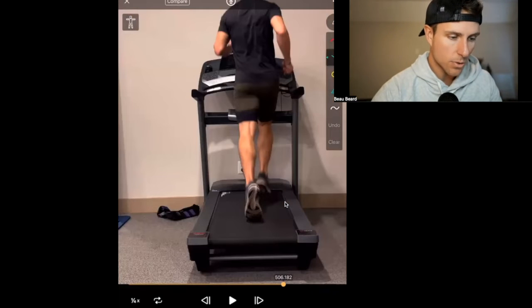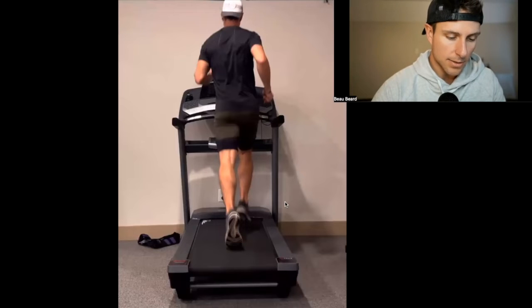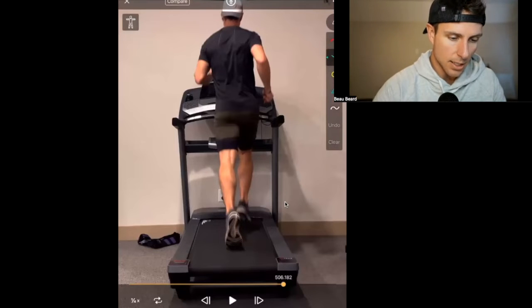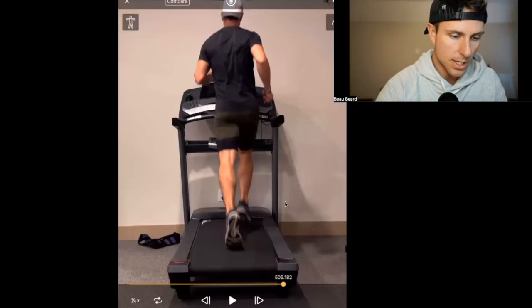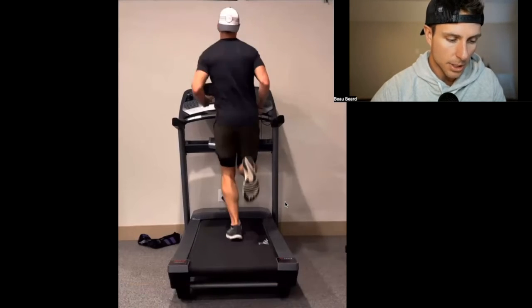because I switch directions here. And this is where the big reveals come from, at least with my gait, because as we'll see on the Runeasi tech here in a sec, there's some definite left-right asymmetries, which is one of the bigger things that we're going to see in a runner.